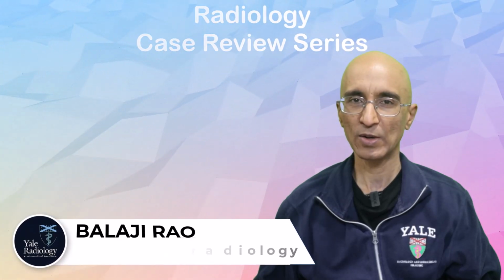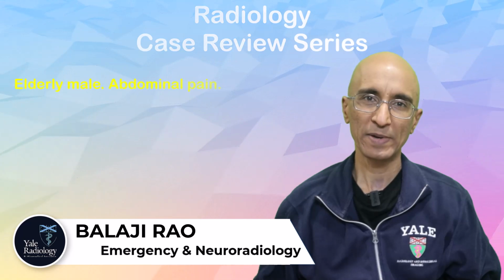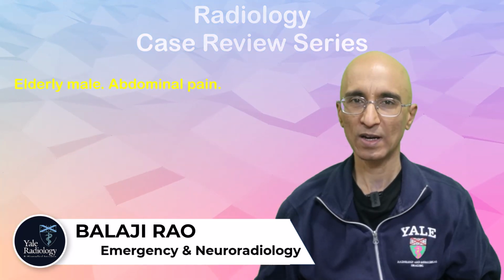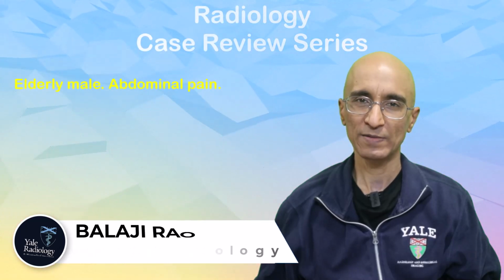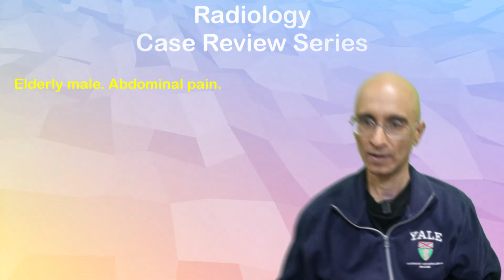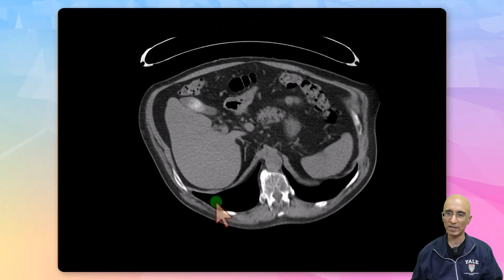In this video, we are going to look at images of an elderly male patient who presented to emergency department with abdominal pain, nausea and vomiting. I'm going to start initially with the CT examination performed many years before the current admission. On the CT performed many years ago, you can see a gallstone in a non-distended gallbladder.